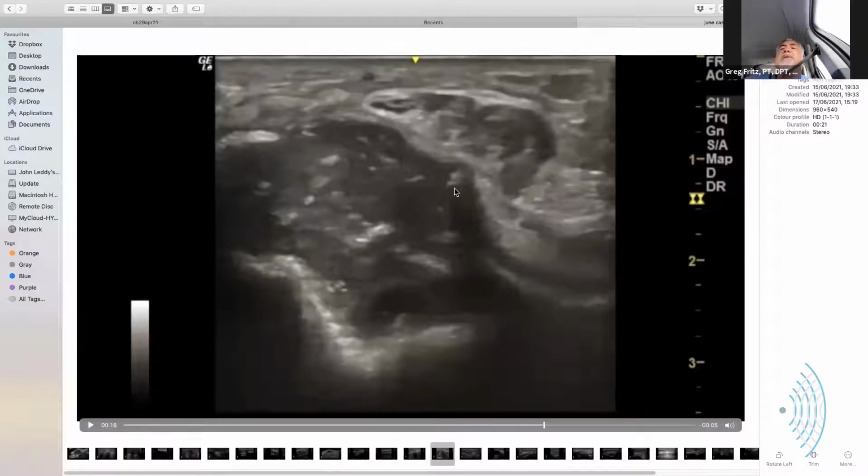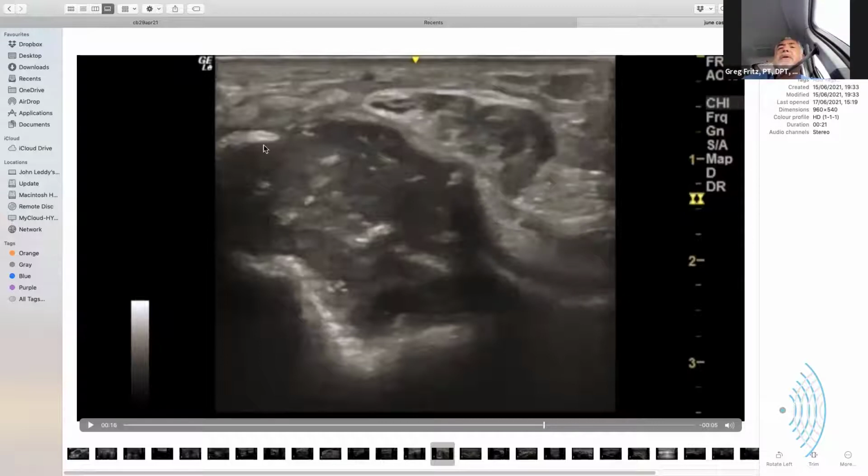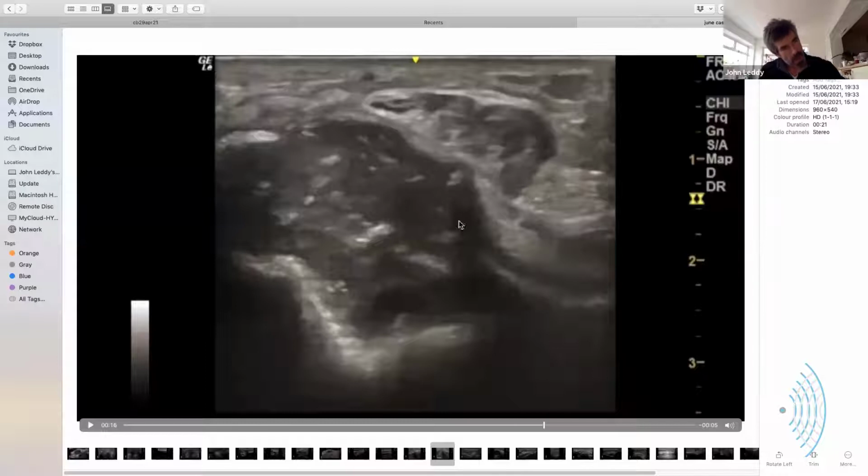Yeah, help me with your thinking. So this is the shape of the bone, but usually you can see where my arrow is. You get the trochlea, and then you get the epicondyle straight away. Yeah. And bones have that shape. This comes to a point, and then it falls away, like some sort of mathematical curve. Yeah. So what is this?